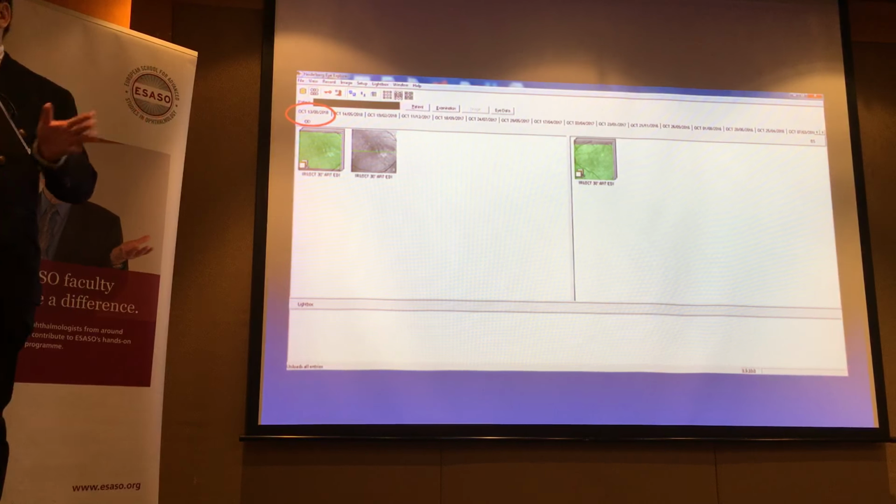This cut here, which is the vertical cut, shows cysts on one side, probably a BRVO because this portion is normal. All right, but if you were to rely on this, you might argue, well, I see 1 or 2 cysts there. But at least your assessment of this scan versus this scan would have been quite different. Would you agree? Your impression of the activity. So don't rely on this.